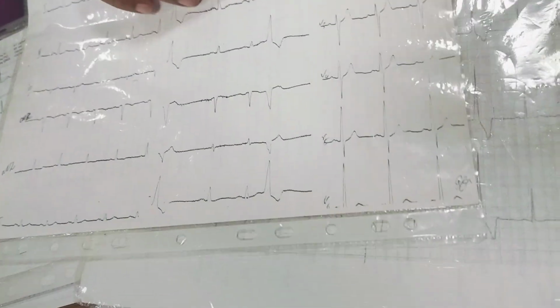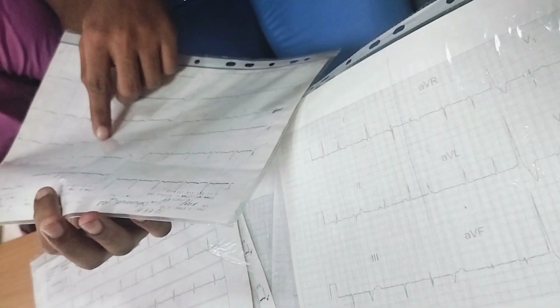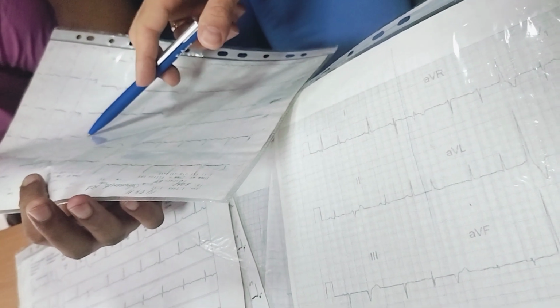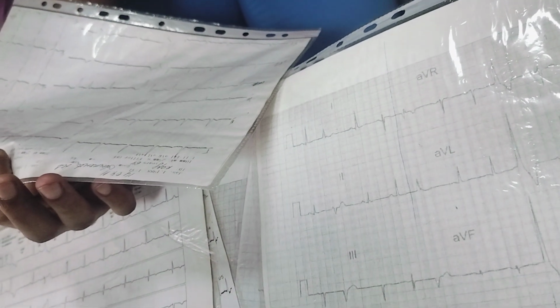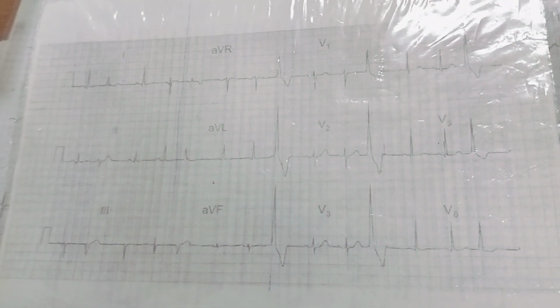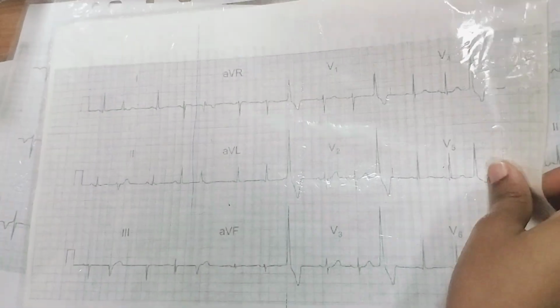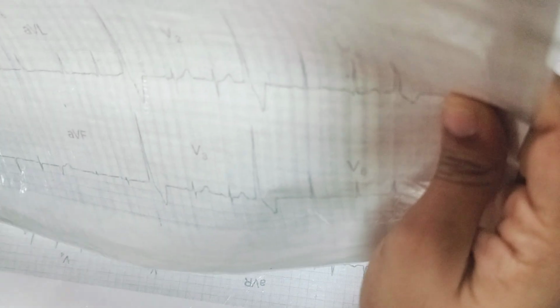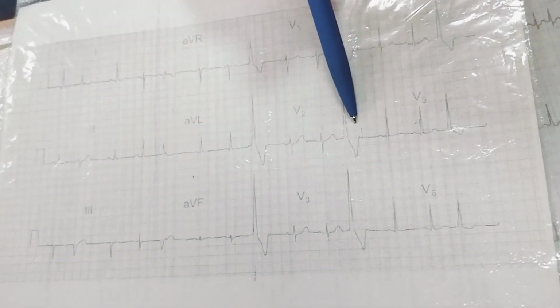Here there is a P wave, and the PQ interval is the same as previous. It is the interval of connection, the criterion of extrasystole. In extrasystole, the distance between the last normal and the extrasystolic complex is shorter than normal. The distance after the extrasystole and before the next normal complex is longer, with the same wide deformed QRS complexes.